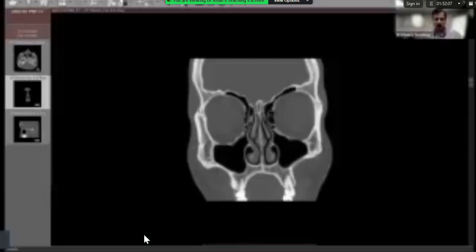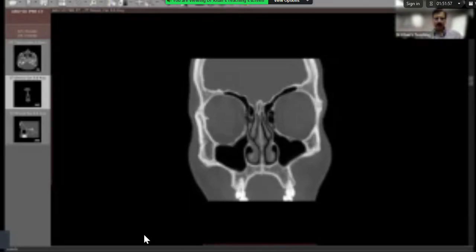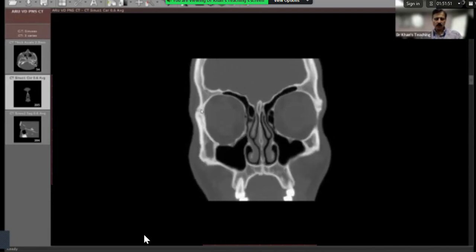This is the lateral wall of the orbit. This is the medial wall of the orbit. So I'll show you a few cases later on, and you have to tell the examiner if the fracture is going through it or the lateral wall is also fractured or not.